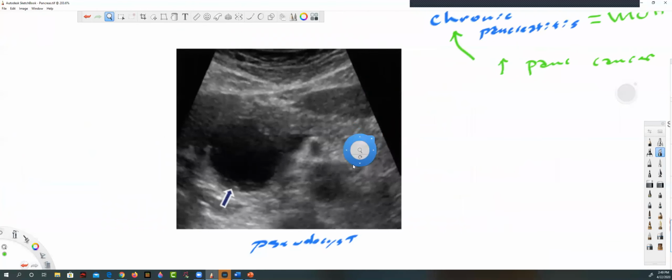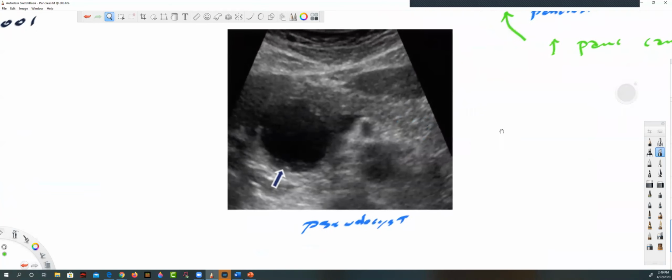Oh, and my other pseudocyst was all the way over here. Wait. This pseudocyst, I'm sorry to go backwards, but I just saw that. I forgot about this picture here. Kind of a bad drawing, but at the head of the pancreas, here's that uncinate process there. The head's kind of distorted. Median left lobe liver there. Okay. Anyway, we can go away from that.